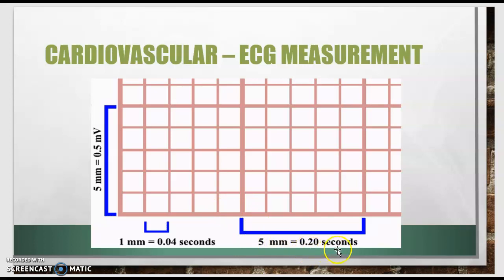And so if you have a QRS wave, if you remember from the previous slide, your PR interval can be 0.12 seconds to 0.2 seconds. That's what's considered normal. And so it can be as long as one big red box. So this is kind of how you measure.